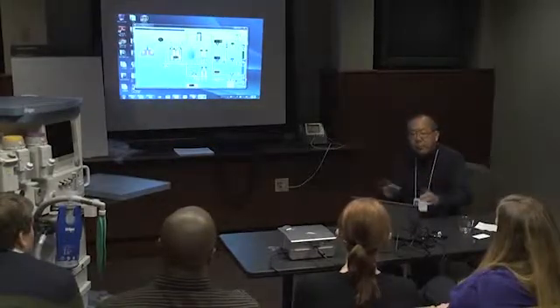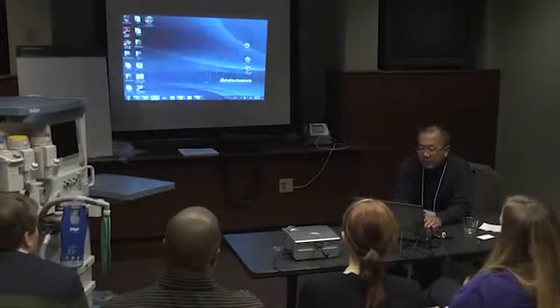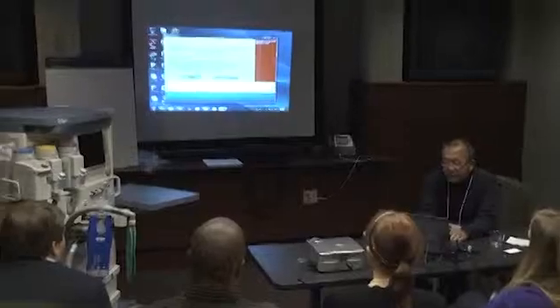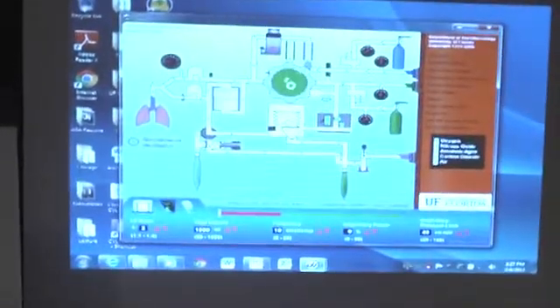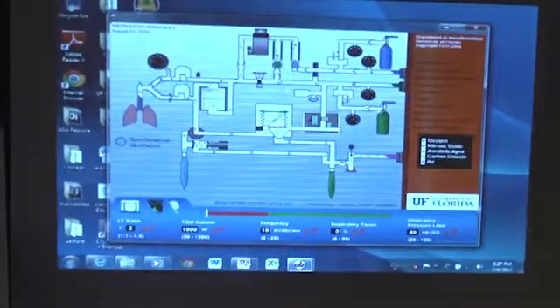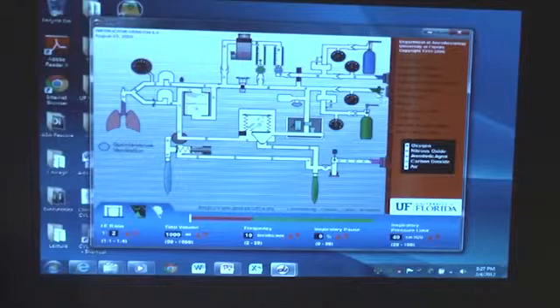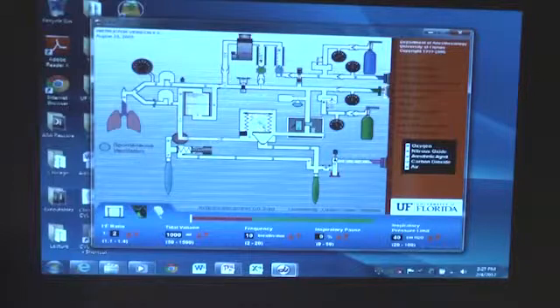So if both are open, like right now, both are open. Actually, it's probably a better demonstration on this one. So if both are open, so I'm going to open both. You see? When both are open and then I lose my oxygen, there's no alarm. Okay? But if on the other hand this was closed and I lose my oxygen, now there's an alarm.